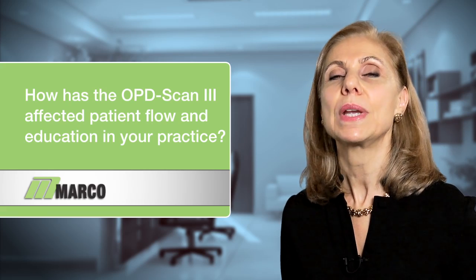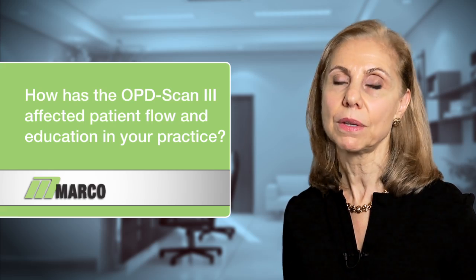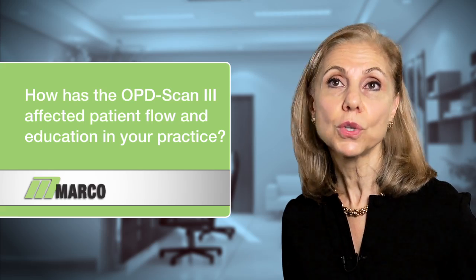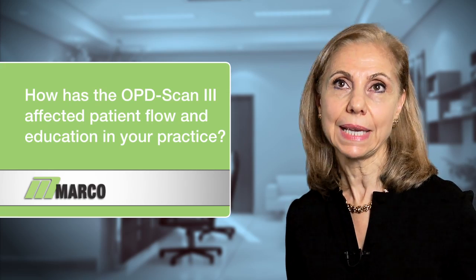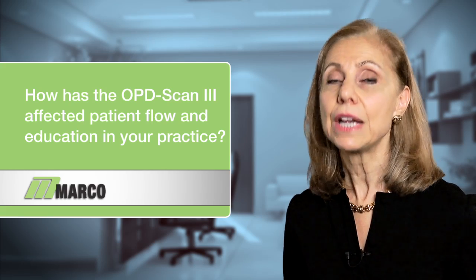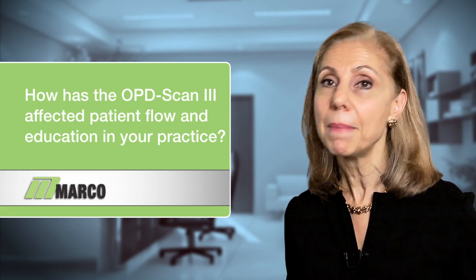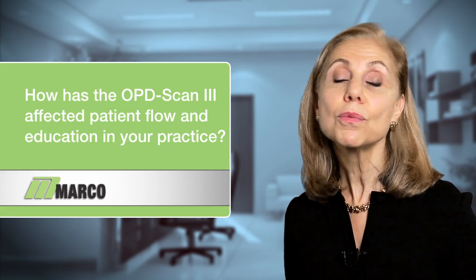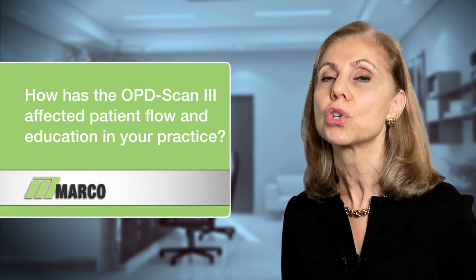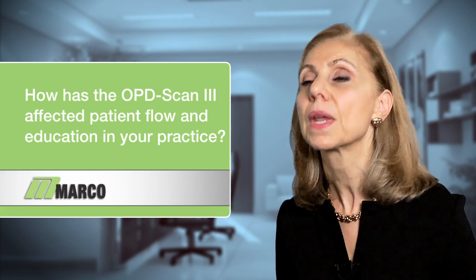With the OPD-III, we are able to capture many points of information within 30 to 40 seconds with one seating, rather than moving a patient from station to station, instrument to instrument, which could take many minutes. Within 30 to 40 seconds, we can capture a very large amount of information with the OPD-III.